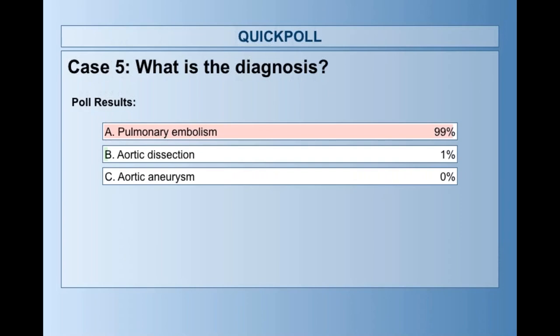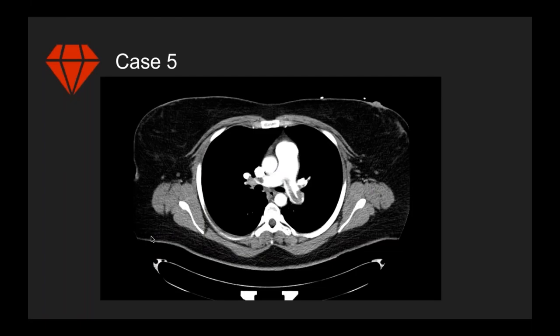Excellent. So like I said, this was really quite straightforward. It's a pulmonary embolism. It's not an aortic dissection. If we go back to this, this is the money shot really. You can see that there is this filling defect, almost like a saddle embolus going across both main pulmonary arteries. And this is a very common scan that you're going to come across on call. CTPAs get done all the time out of hours.